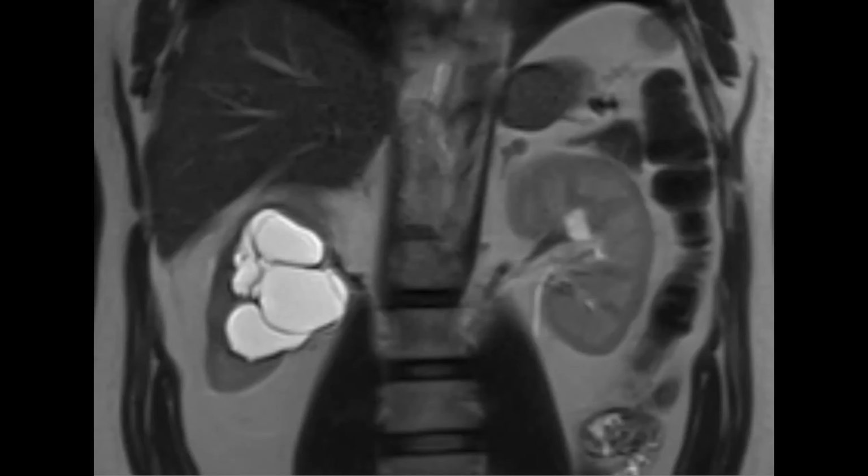Similarly, the 2016 WHO classification includes cystic nephroma within the MEST family. At least in our institute, the pathologists don't give cystic nephromas as a differential anymore. They just say it's a MEST tumor. So whatever held good for us previously for cystic nephromas, in which we said it's multilocular and protrudes into the renal sinus, is actually cystic nephroma, which is the benign end of MEST.